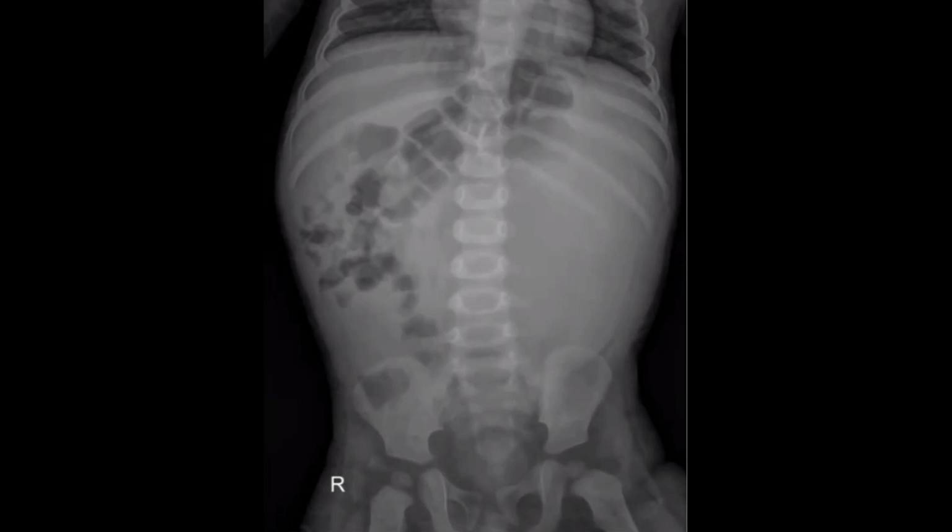So, as you said, you did very well. We have a large soft tissue density located at the left side of the abdomen, displacing the bowel loops to the right side. In this pediatric age group, I think maybe 4 or 5 years, you should think of three main causes: neuroblastoma, Wilms tumor, and I would like to add cystic nephroma.